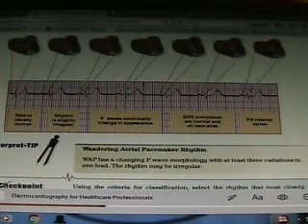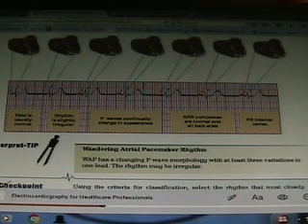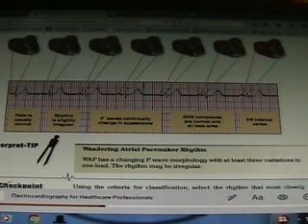Okay? Now you notice that each one of these things, I like the way the textbook goes. It not only goes by what part of the heart gets messed up, it goes by the least problems, like the PAC, and then to atrial fibrillation, which is horrible. So it's going to go, like every wave that you learn, it gets worse. So let's look at this one. This is WAP, or wandering atrial pacemaker.